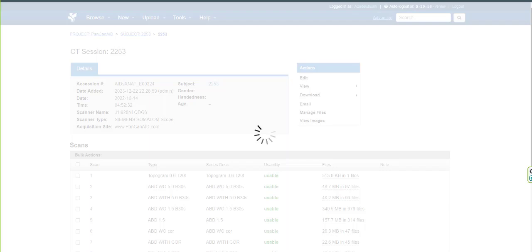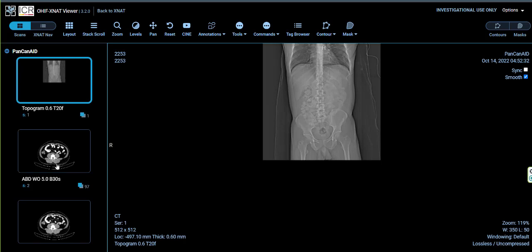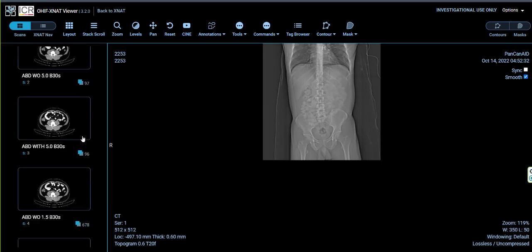It depends on the server workload. I have a 22 core CPU with, I guess, 40 or 60 gigabytes of RAM. But I'm currently uploading some of these cases, and that's why my server is not that fast for now.